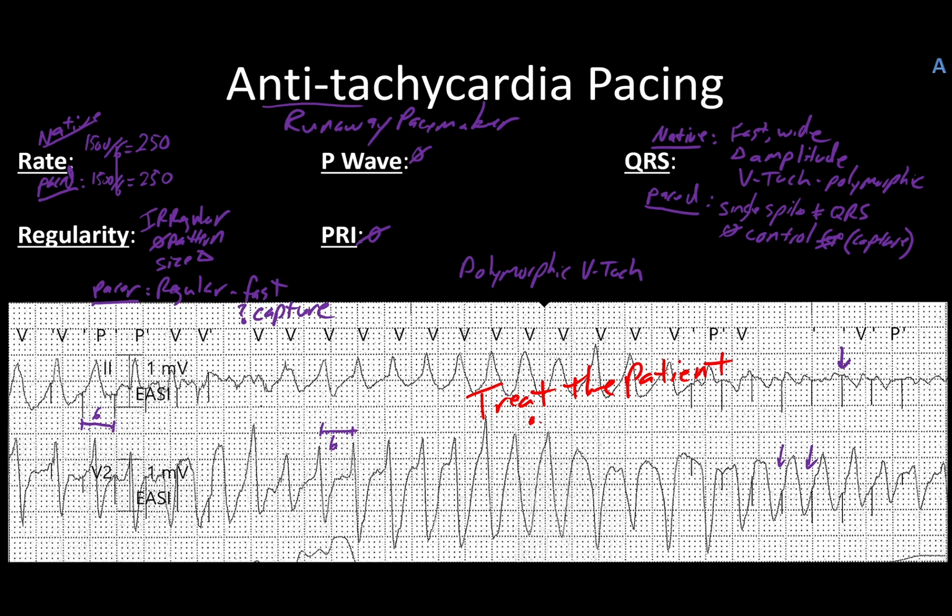You're going to be looking at the symptoms, and likely in this case, they're not going to have a pulse and all that good stuff, so you need to do your ACLS, compressions, and defibrillation.